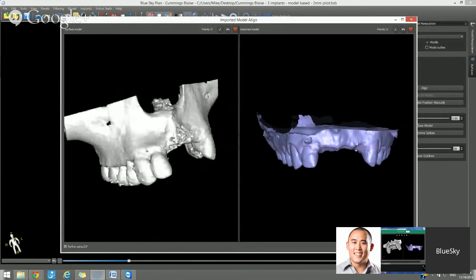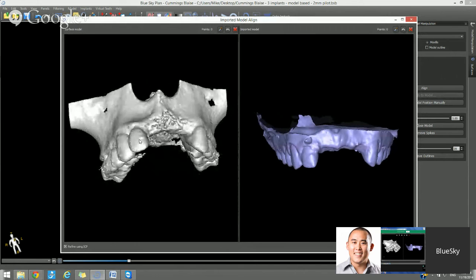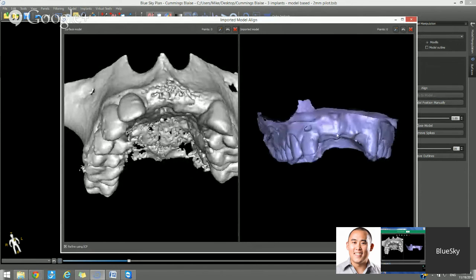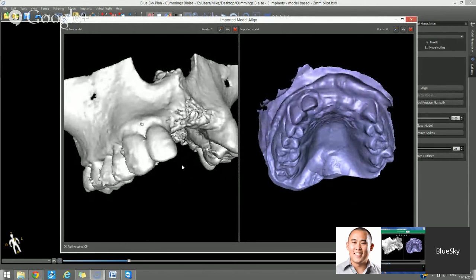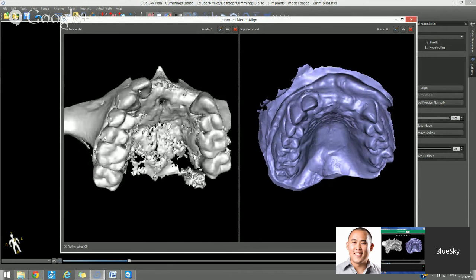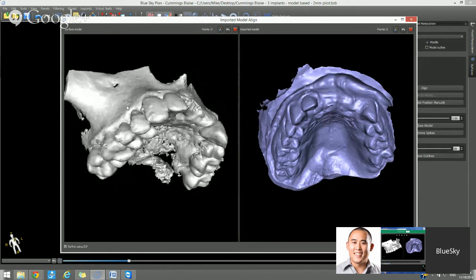Here you're able to use your mouse functionality that we discussed. You could rotate, you could zoom in, you could zoom out, you could grab it, you could rotate it. Here's the model. If this was a real case and I had more time right now, I'd probably hit cancel, raise the density threshold a bit more to better define our teeth for us and to have clearer points. But this is fine for now as well.